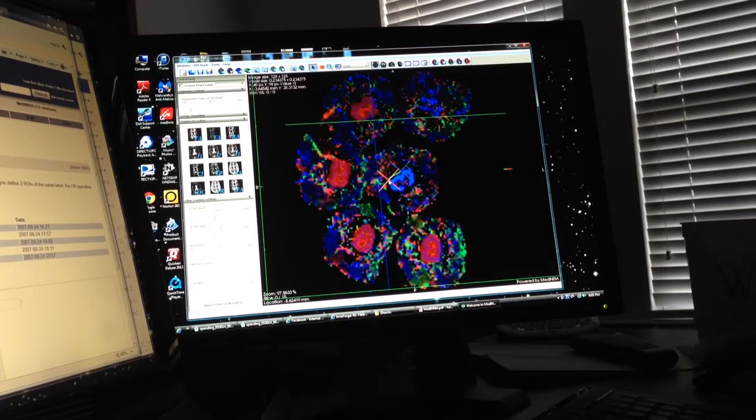I'm just left clicking and drawing an ROI around what I just grossly think is the cord area. And I'm just going to do this on this one slice, but you could do it across all 15 slices to have nice, pretty ROIs. Then I'm going to go up here in the top right-hand corner and click this Limit Fibers to ROI.